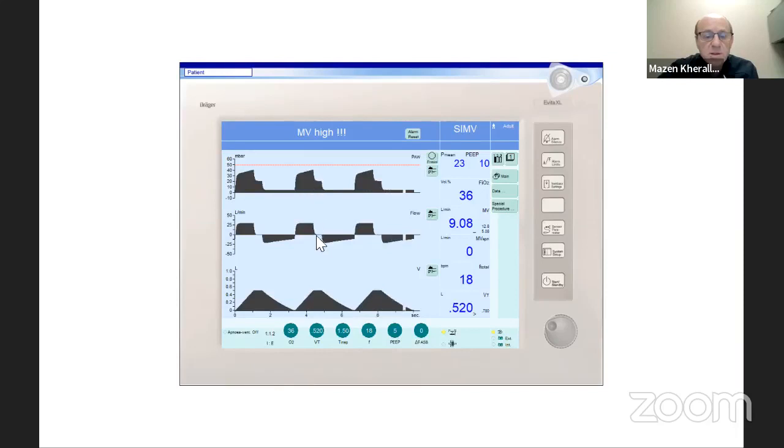So the inspiratory time is not finished. However, the tidal volume is delivered to the patient. And then we still have time in inspiration. That is why the pressure went down to the plateau level. This pressure is needed to keep the air in and overcome the lung and chest wall compliance. You can see the flow here is at 0, meaning that there is no air going through the airways. And that's why we don't need the pressure to overcome the airway resistance. And that's why the peak inspiratory pressure went down to the plateau level.